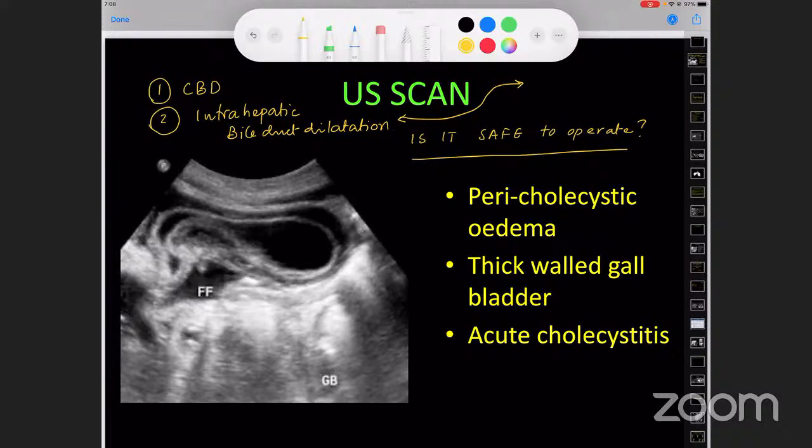I would also pay great attention to the thickening of the gallbladder wall, whether it's less than 3 millimeters, as Dr. Avik Bhattacharya quite rightly said. Sometimes you have a 6 millimeter plus gallbladder wall, and there you can have a really tough gallbladder to do, particularly if you're planning for a laparoscopic cholecystectomy. There you might have to plan for a subtotal cholecystectomy.